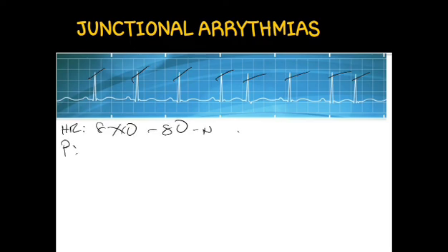Okay, now let's check. The P wave in this area is present, present, present. Also present, but take note of this rhythm here. This rhythm doesn't have a P wave, and then this rhythm has a P wave, and this one has no P wave. So meaning that the P wave is present in some rhythms, but there are rhythms that have no P wave.